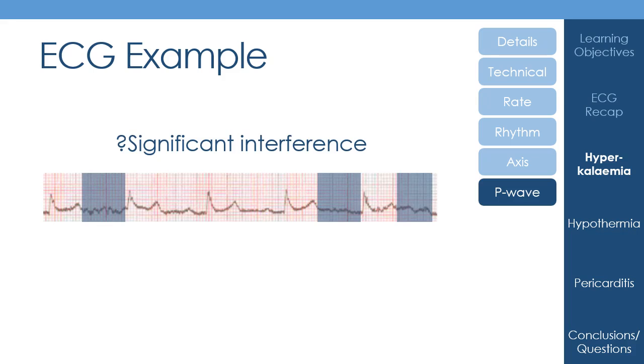But there's quite significant interference here, isn't there? And I'll tell you that this isn't just that the nurse didn't attach all the leads fully because she was very busy or anything like that. This is a good quality ECG performed. And so there is quite significant interference.